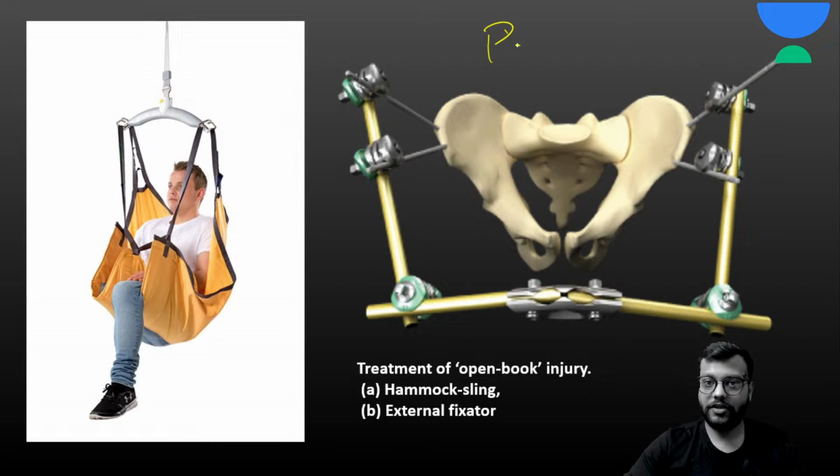And this is your external fixator assembly used to treat the pelvic diastasis like this. And here the pins that are used, these pins are called as the Schanz pins. Okay, these pins are called as the Schanz pins.